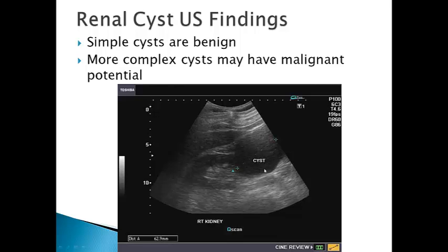So that's how you can differentiate simple cysts, which, like I said, if they're simple, they have very minimal malignant potential, virtually none. So something to keep in mind with benign masses.